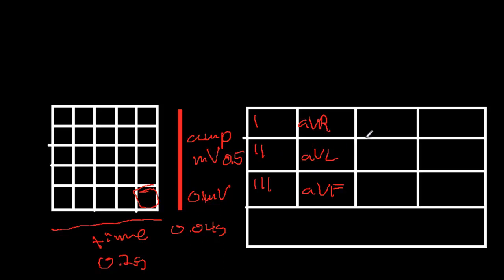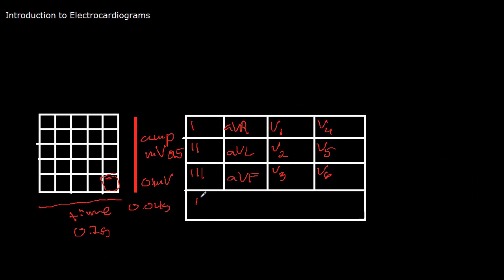So right over here are the limb leads, and over here are the precordial leads. This is V1, V2, V3, V4, V5, and V6. And usually down here you'll have a longer strip of several of the leads that are above. Often it's going to be limb lead 2, it could be 1, it could be F. Those change, but usually 2 is down here.